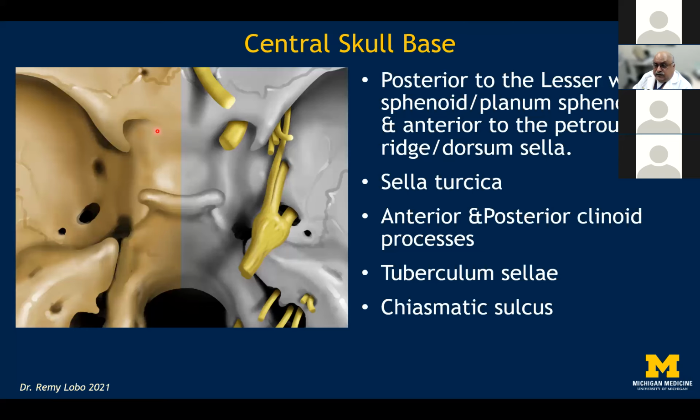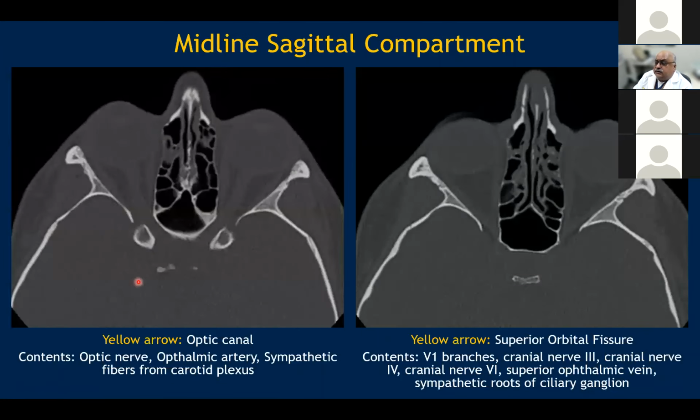So one can imagine that the time-long conventions of naming structures have become so ingrained in us that we just think in our mind's eye that they may be related to the actual structures which are in the vicinity of that nomenclature. So here are certain important foramina which are the bane for all examinees and examiners.